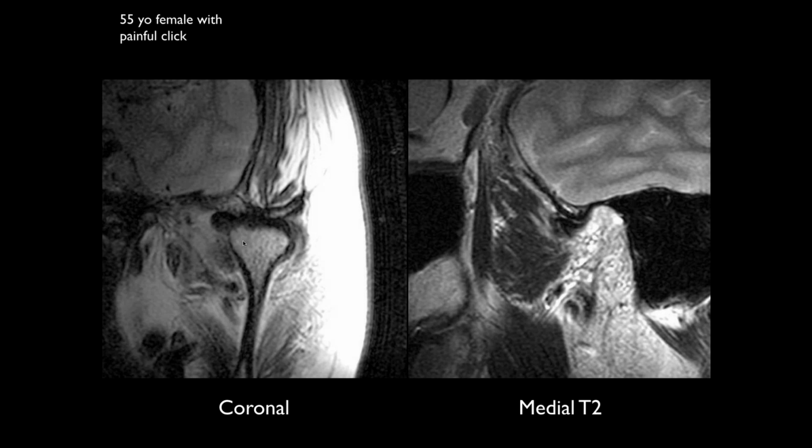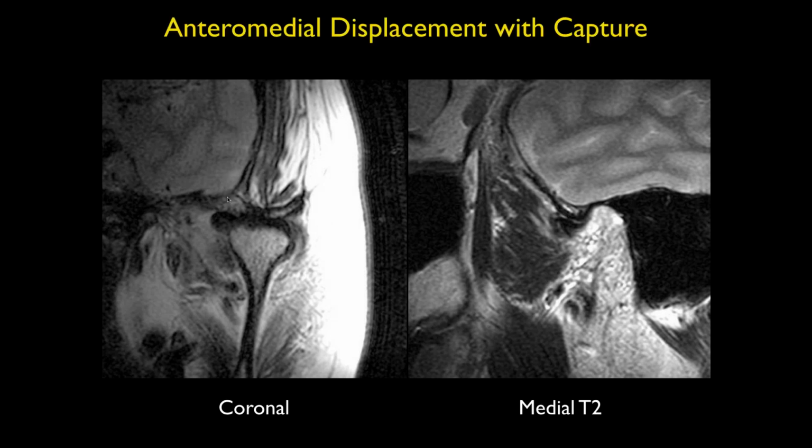So what happens in this case, the patient, it's anteriorly medially displaced in the closed mouth position, and then it captures in the open mouth position. This is sagittal right through this plane right here. Okay.